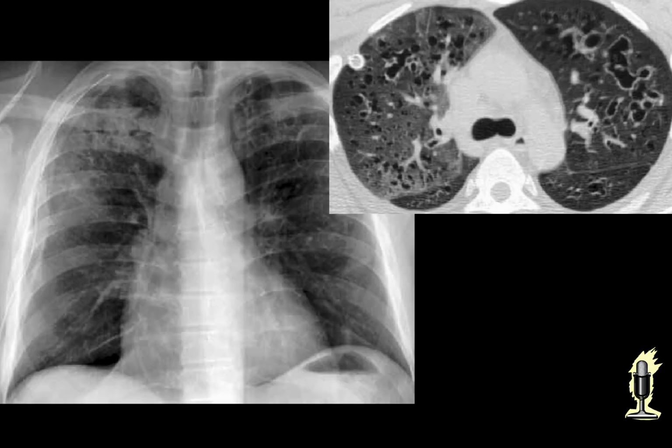Note the severity in the upper lung, especially the right upper lobe, and the bizarre-shaped cysts at CT. Patient presented with a right spontaneous pneumothorax treated with a chest tube. Multiple ground glass centriacinar nodules spare the lung periphery.